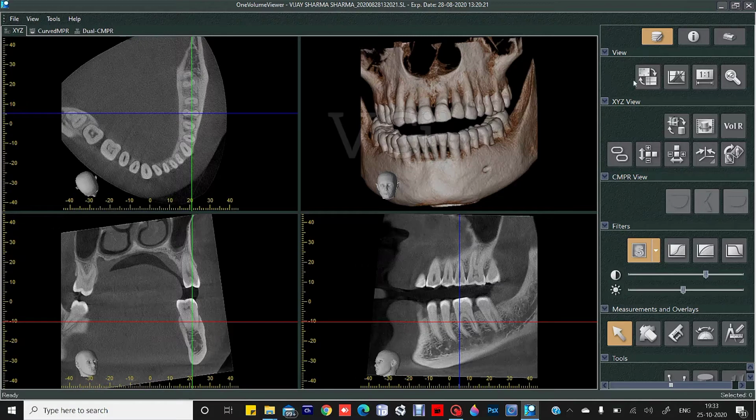So coming to this, just to know about the software, what you basically have to do, just drag the mouse without clicking any buttons on the mouse. Just take your mouse to the buttons. It will automatically show or hide the positioning cursors, then view the histogram window, see images in 1:1 ratio or magnifying. So let's talk about each button in a detailed manner.